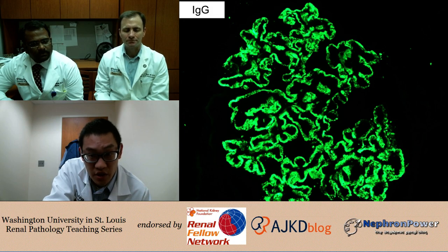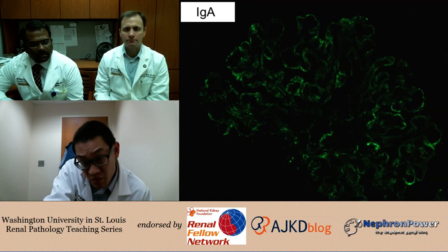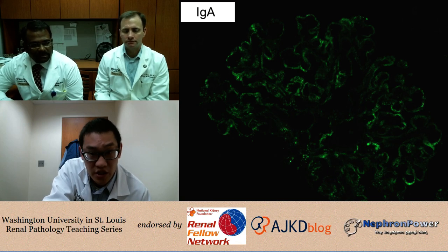Okay. So I'm going to just breeze through this. This is IgA, essentially negative, at least compared to the IgG.